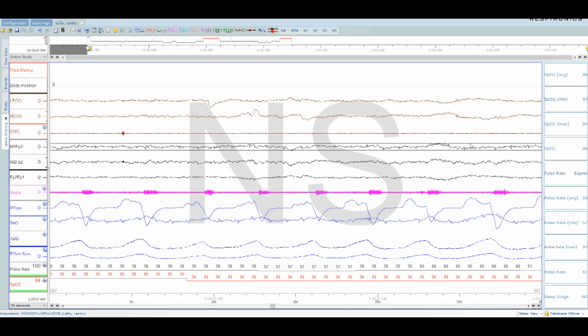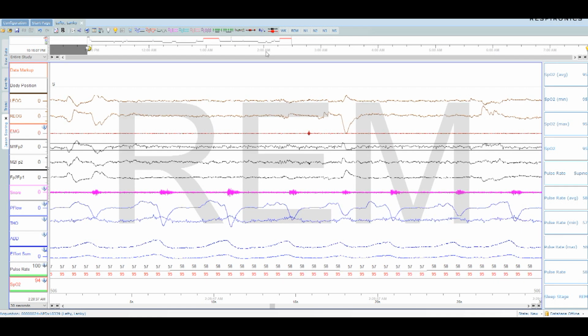So we're back into REM here. As you can see, this is interesting. I'm going up to this top hypnogram here. So we have, slightly before 1 a.m., a REM onset. So we would expect REM to appear about an hour and a half after that, which would be 2:30, which is pretty much right where it started here.